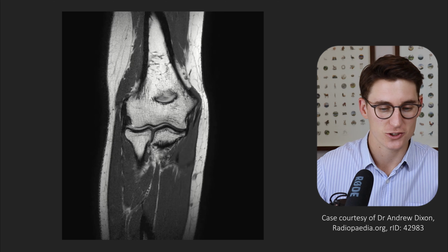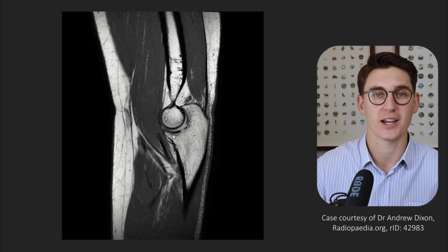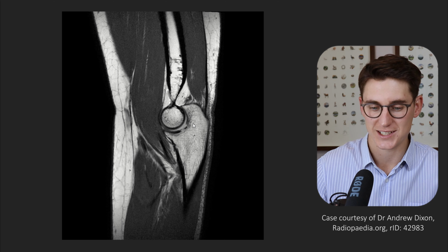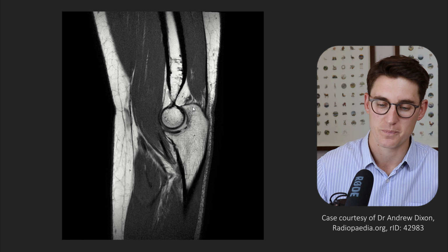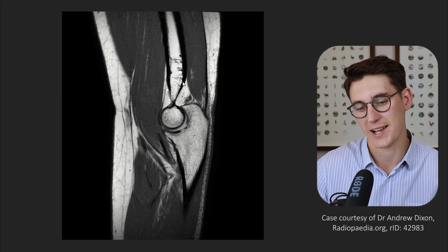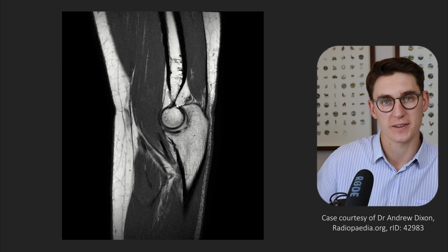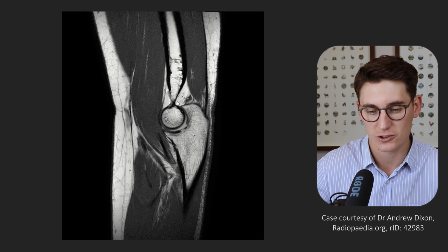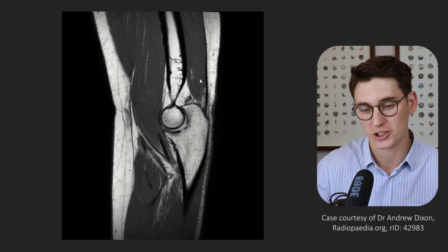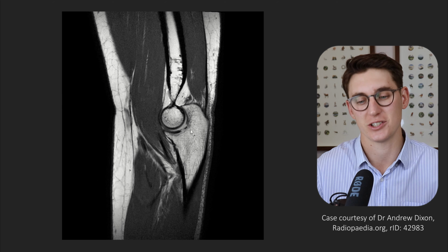If we look at this in the sagittal plane, we're cutting the humerus here in the sagittal plane. You can see our trochlea here, our trochlear notch of the ulna with our coronoid process, and posteriorly our olecranon. We can see there's a depression, a shallow depression here called our olecranon fossa that's filled with fat. And we know that if we get a joint effusion and that fat pushes away out of that fossa, we get a radiological sign on our radiographs called the sail sign posteriorly and anteriorly as well.